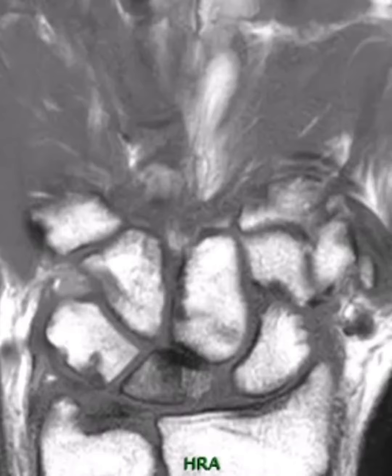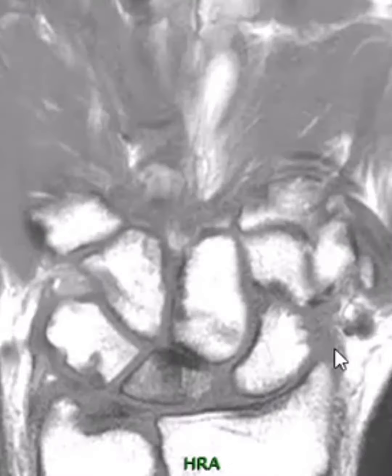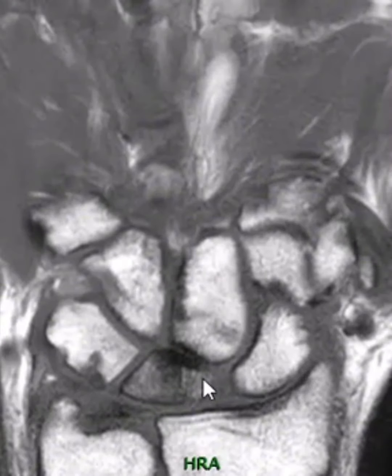This is the MRI of the hand. The patient had a ruptured tendon of the fifth digit, but they also have this entity, which is avascular necrosis or Kienbock disease, or some people call it lunatomalacia. It is abnormal blood supply to the lunate bone, and it gets weak, collapses slowly, and deforms over time. This is the lunate bone over here.